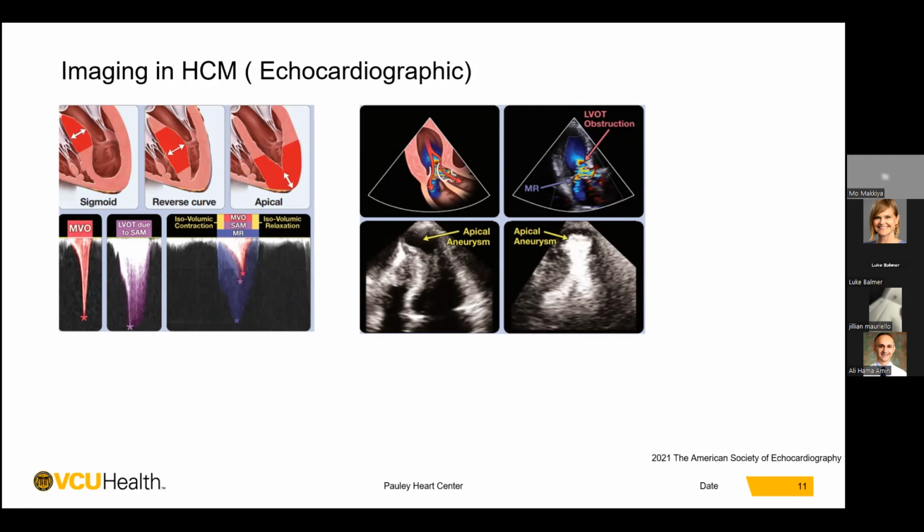But mitral velocity has a higher and longer duration, spanning through the isovolumic contraction and relaxation, not like the dagger-shaped LVOT velocity, which is prolonged and then peaks up suddenly. Echo also helps in evaluating other velocities when you have intracavitary gradients, like from the hyperdynamic LV at the mid ventricle or the apex; this is not obstruction by definition.